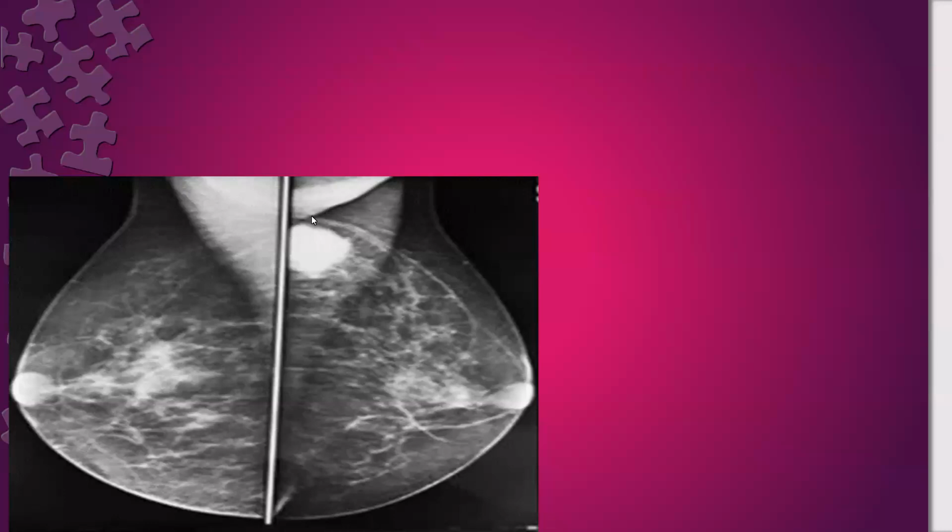And this, what is the structure? This is the pectoralis major. And what about this? This is the pectoralis minor, and this is the pectoralis major. Okay. The mass is high density, irregular, spiculated. Associated with what? No association.